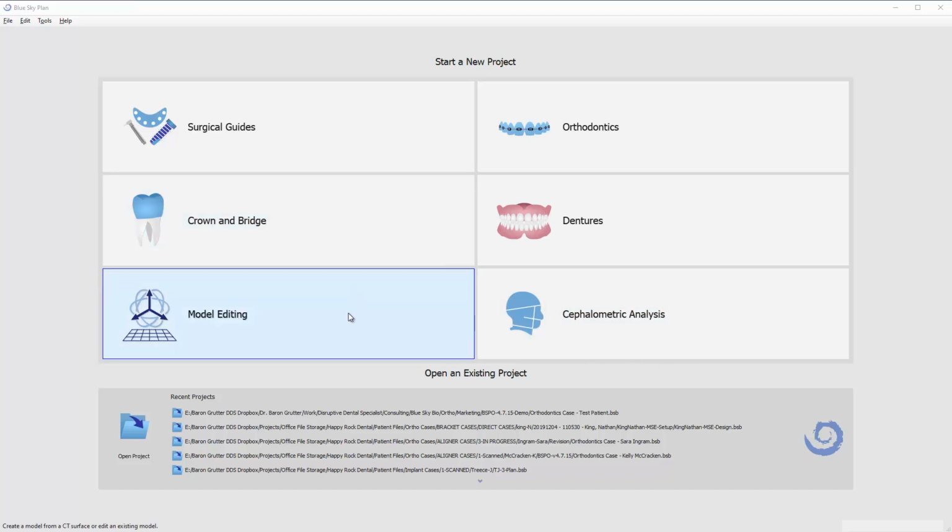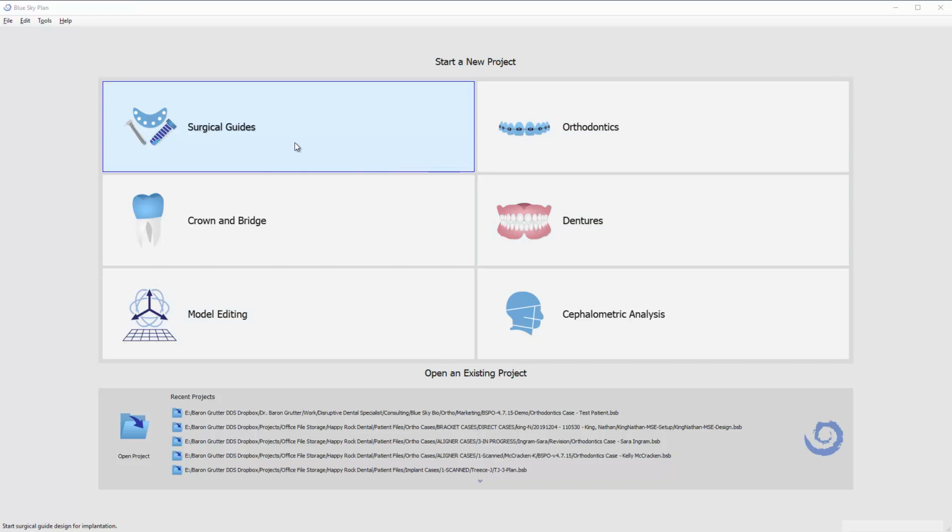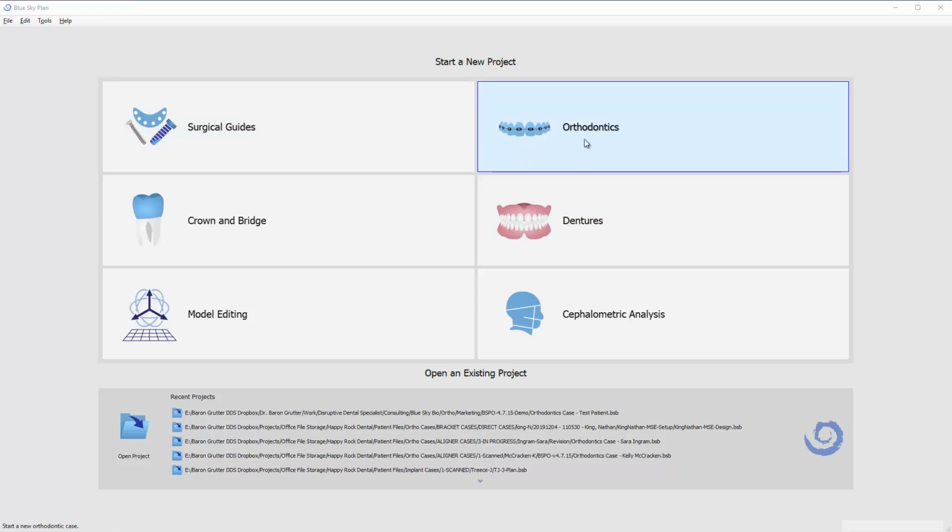The crown and bridge and the model editing are very much in active development. Ortho is constantly being updated, as is dentures, and surgical guide has been around for a while, with updates once in a while, but this series of videos is going to focus on the orthodontics portion.